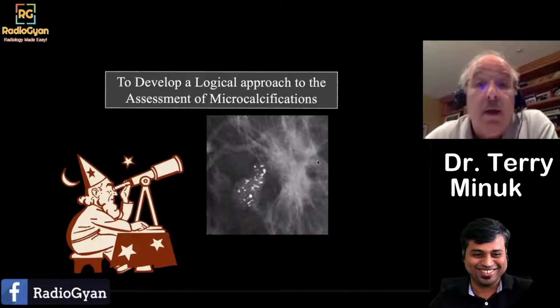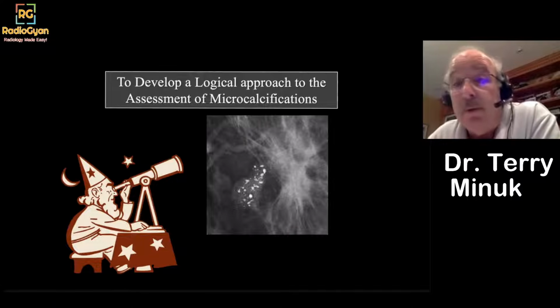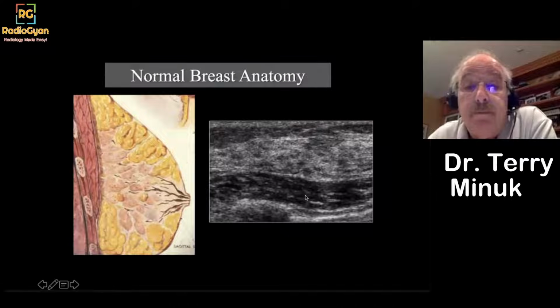Thank you, Amar. Today, what we're going to do is look at microcalcifications in the breast and try and develop a logical approach on when to biopsy them and when not to. So I may not be able to tell you if these calcifications are benign or malignant, but at the end of the talk, you'll know exactly how to handle them and deal with them.